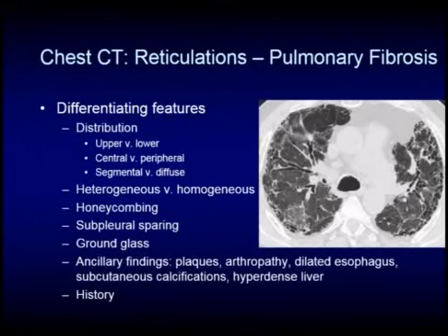Is the pattern that you're seeing a heterogeneous pattern? Is it a more homogeneous pattern? When you compare right and left sides, do they kind of overlay or mirror one another, or are they very different? You also want to look for honeycombing, subpleural sparing, ground glass attenuation.